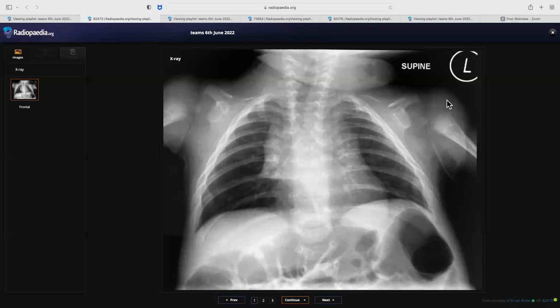Those are the review areas, like checking all the bones, and after you haven't found anything, because sometimes in one go this thing doesn't come to us. Like in the previous case, Nail-patella syndrome, the patella was absent. Here the clavicle was absent. We are not used to looking for those things which are absent. Actually, we keep looking at those things which are present. Sometimes that happens, which is quite normal.